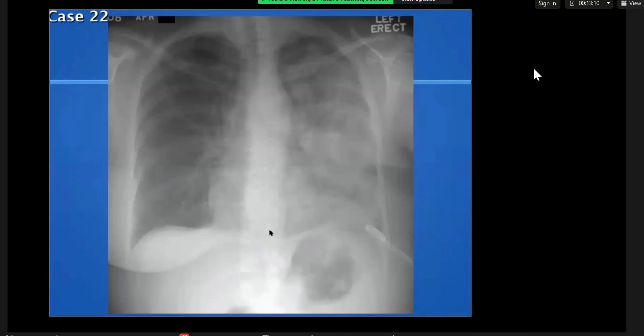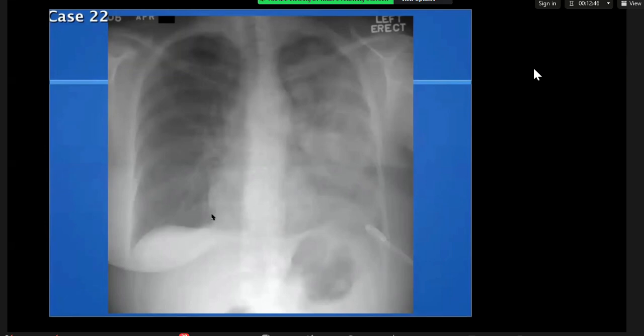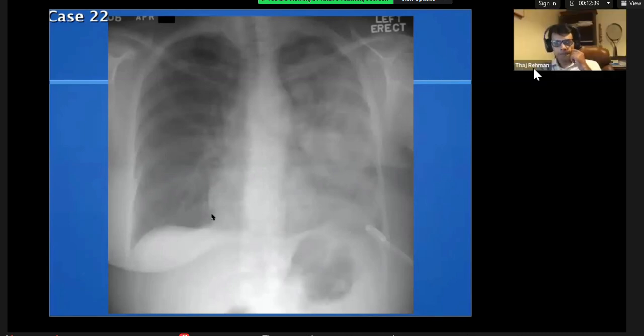So it's a unilateral process. I'm trying to see whether it's bilateral. Since you said unilateral, if it was bilateral, what would you have considered? If this pattern of large lung consolidation exactly appeared on the right side as well, what would be your first diagnosis? Infection wouldn't be. I'm thinking of infection or pulmonary edema, but yeah, I would have considered pulmonary edema first.